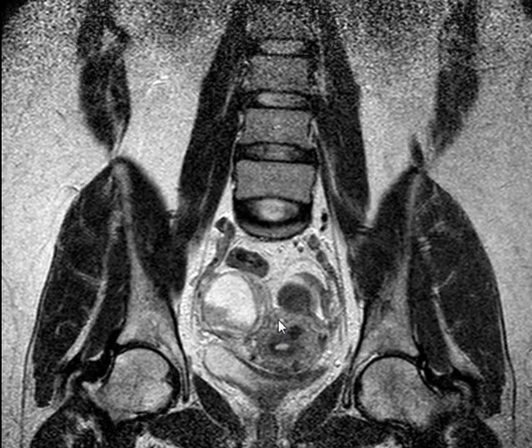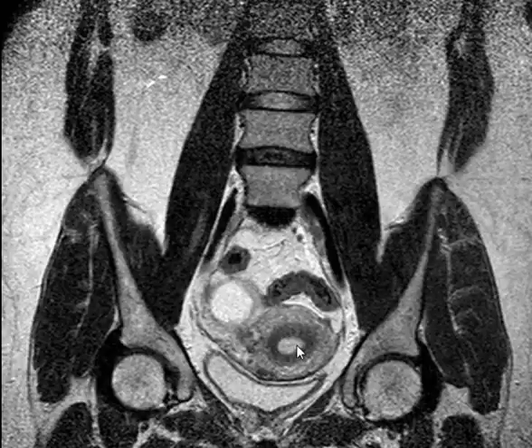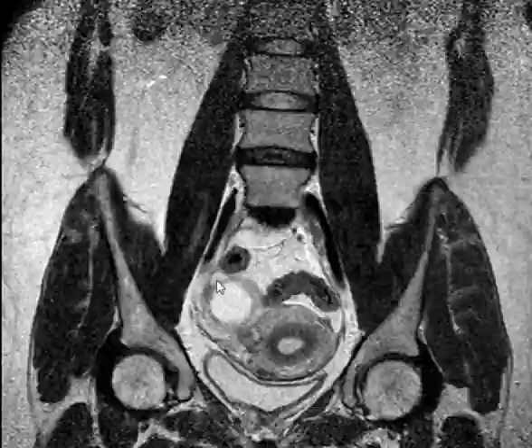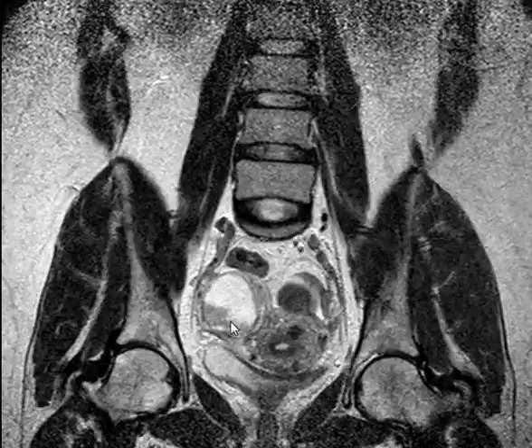I see one hypointense signal within the myometrium anteriorly. I see the other sequences. Maybe a fibroid, maybe. In the right adnexa there is a cystic lesion, a multiloculated cystic lesion, or it is two or three cysts, I don't know. Probably a complex cystic lesion, with mainly high signal intensity.